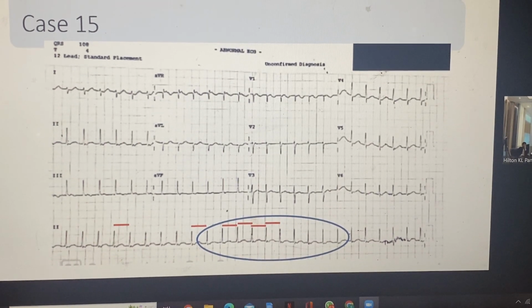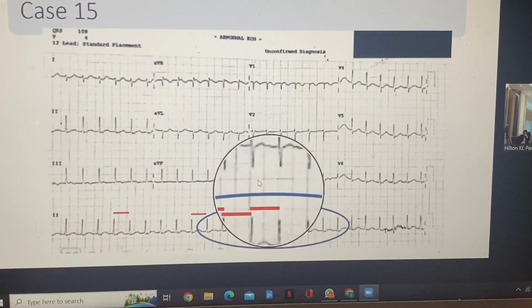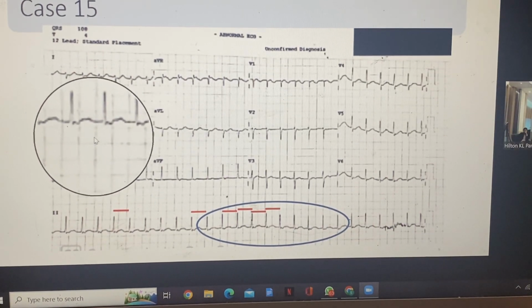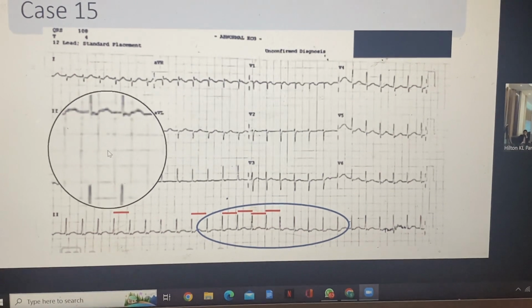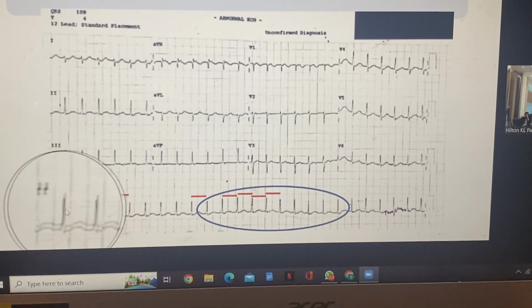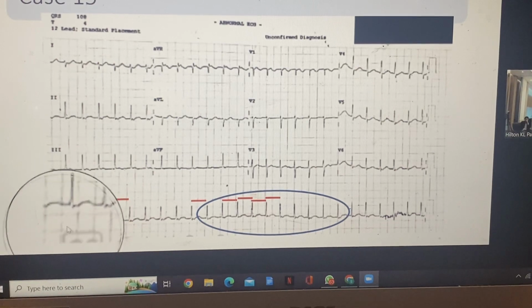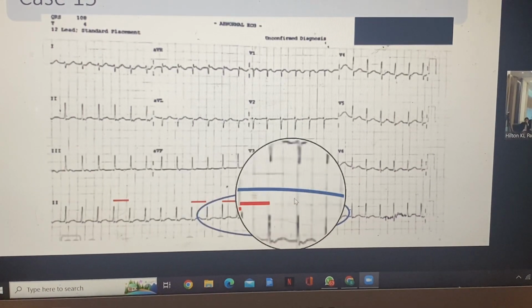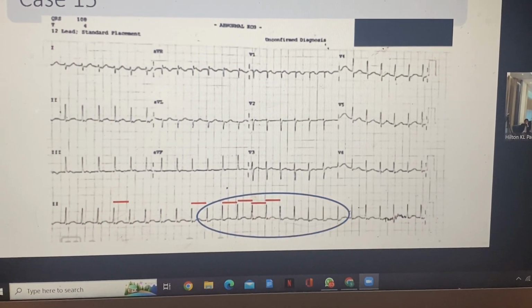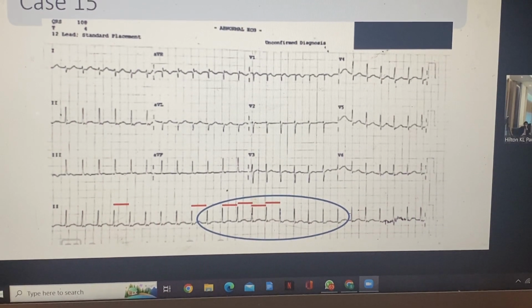The second thing about this case will be atrial tachy. If we zoom in at the inferior leads, 2, 3, aVF, this is a negative retrograde P wave. So it's basically suggesting that this is from the bottom to top. If you're talking about atrial tachy, you're talking about maybe lower down near the coronary sinus. So this A can give to this QRS, but it won't happen here because there is no P wave here. So you can't be giving the QRS to the next one. Because in atrial tachy, your A is a driver. If there's no driver there, then the tachy should stop there.